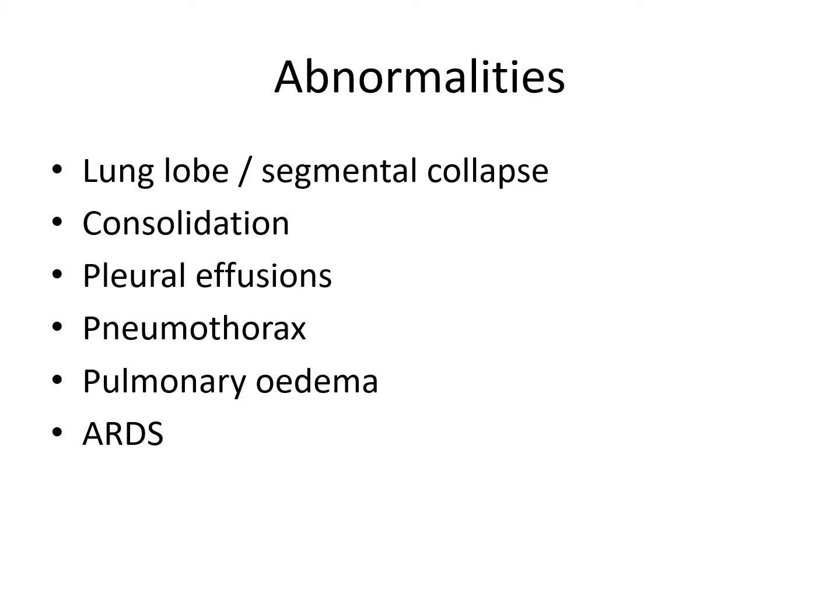And the last one is ARDS, acute respiratory distress syndrome. Interstitial edema produces a hazy ground glass appearance, with patchy airspace edema followed by diffuse and extensive consolidation. This is your COVID lung picture that we've been seeing.